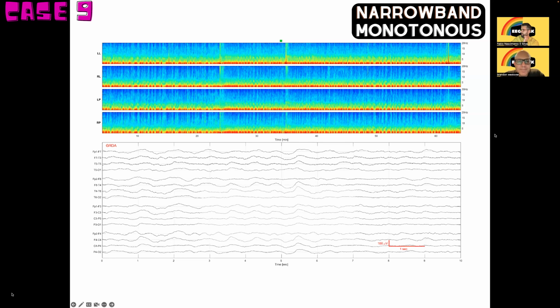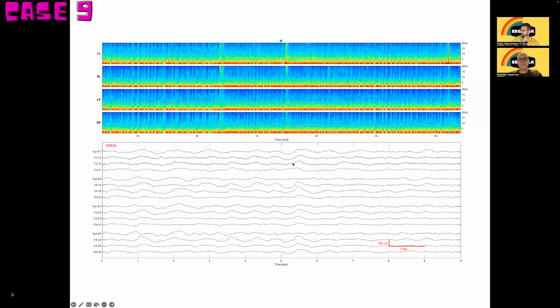Okay, cool. Should we look? Should we peek? Oh, cool. You're right. GRDA is a good call. Nice, GRDA. Okay.